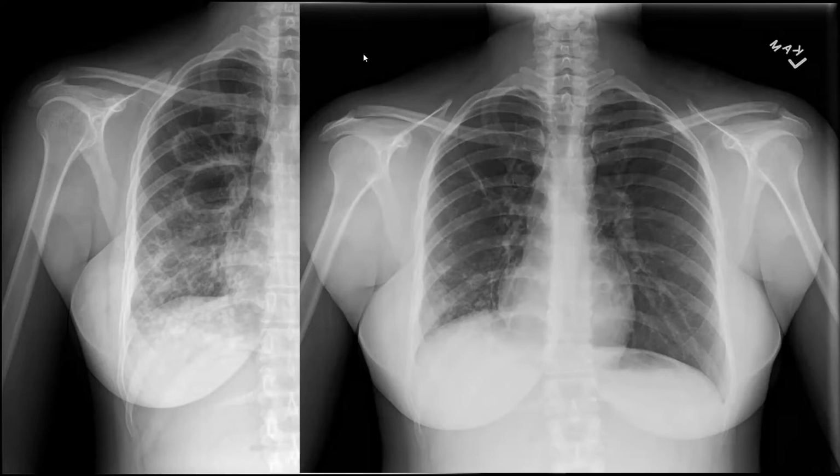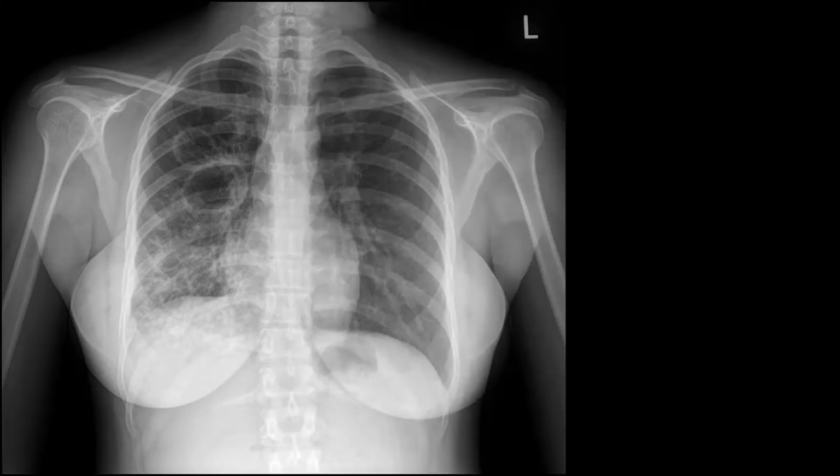I wanted to add one other thing. The chest x-ray that you showed at baseline before she was treated, that's only 8 days postpartum. So I feel very confident in saying that during the last part of her pregnancy, much of that lesion was likely there while she was still pregnant. So this was not a long time postpartum. It was 8 days. So now we have a baby that she's been breastfeeding for the past 8 days with MDR TB and that chest x-ray.